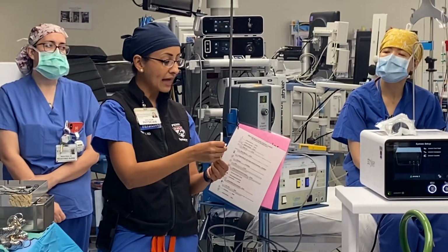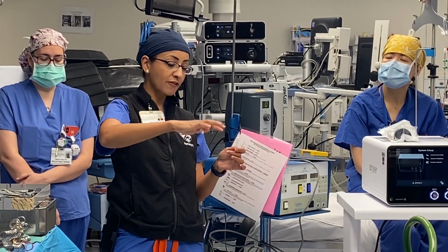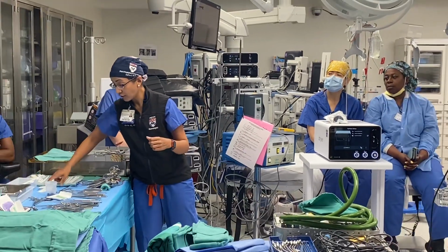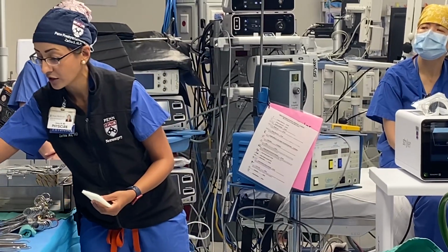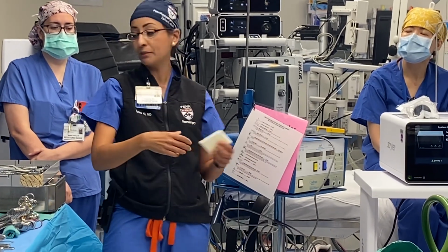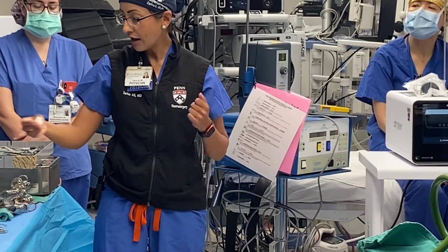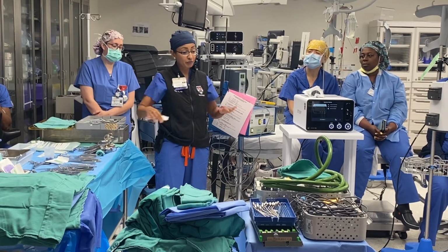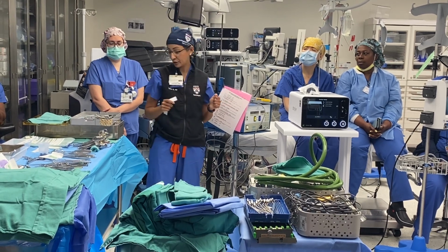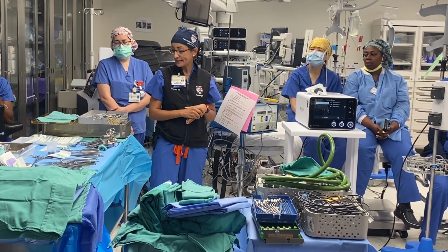Basically what this allows us to do is close off the area where we pop the cranium from, the bone and the dura, and it seals that whole area off. Sometimes if we're right over the sinus, then we need big pieces, pieces that look like this size. So you'll hear us say we're right over the sinus, big sinus gel foam pieces, okay? So that's what that means, and then we use Floseal, we use gel foam, we'll use these patties to really block off that blood. Again, you will die on the table if that bleeding persists, okay? So that's where we get all that nice hemostasis.